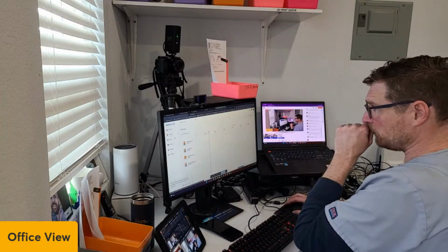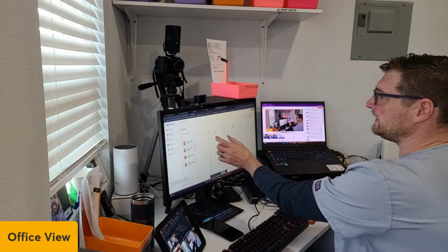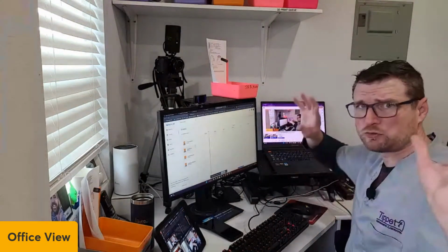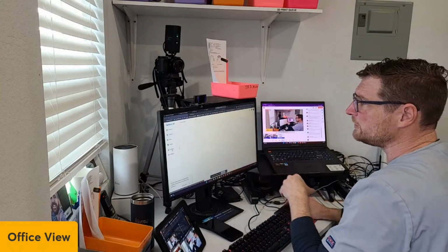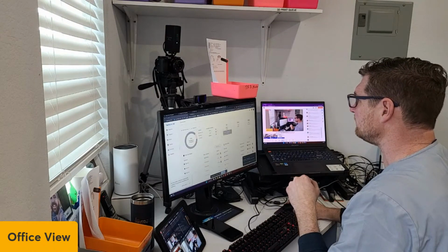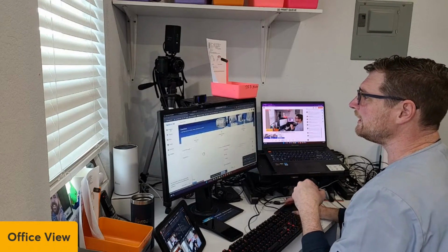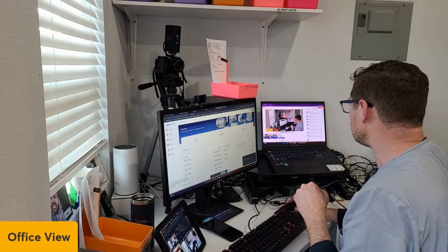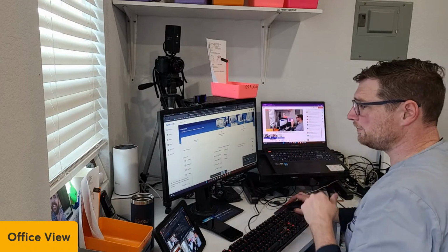If you're running multiple printers, you can see them all here, and they're printing and when they're going to be done, and you can schedule all that. If you're a big lab, there are some labs that have 12 of these printers, and they can control them all in here: who's printing what, what materials they're using, how much I have used, how many resin tanks I've used. So this dashboard's pretty cool for you. I can't share this screen yet, but we've got that set up in the back.